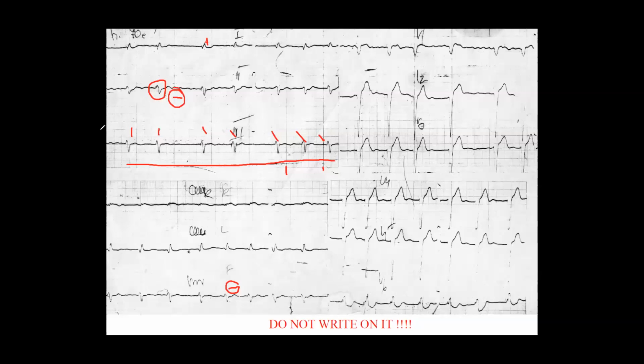So you can go for an extreme left deviation. Do I need to say the degrees? No, it's okay. I already said that it's around -30, a little bit more than -30. And if you go for the aVR, it's equiphasic, so -60. So it's an extreme left deviation. Doesn't matter. All right.